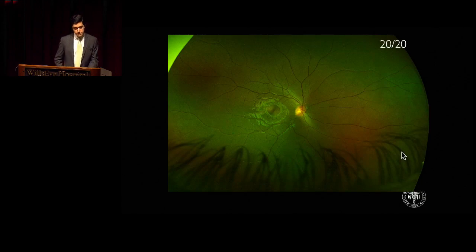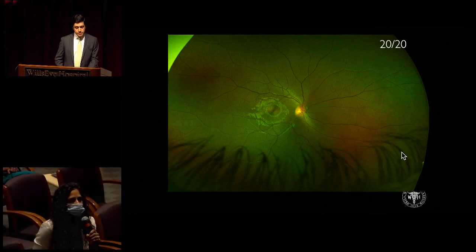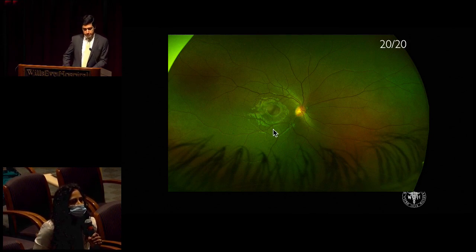So, wide field pseudocolor fundus photo of the right eye. Vision's 20/20. Media looks clear. Disc margin looks sharp. Cup to disc 0.2. Vasculature looks normal in course and caliber. Macula looks normal. You have this nice nerve fiber layer sheen seen in younger patients.